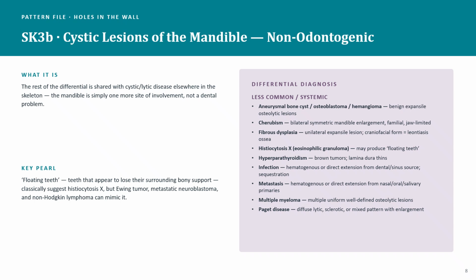With these, it has nothing to do with the patient's teeth. So it's jaw lesions, but again, not caused by the patient's teeth. Instead, they're coming from other diseases that are affecting the bones of the body. So when these are seen on x-rays, we might see areas where the bone has actually been destroyed or where the jaw is actually enlarged.